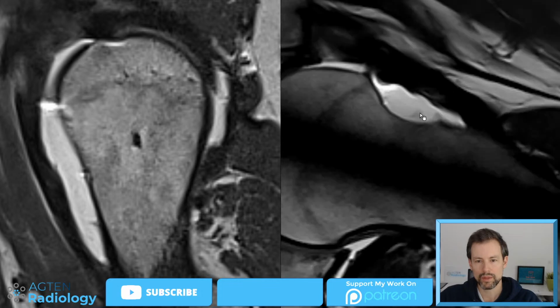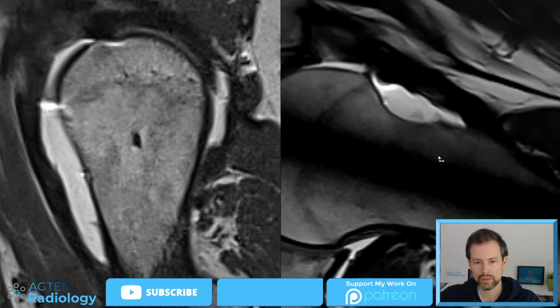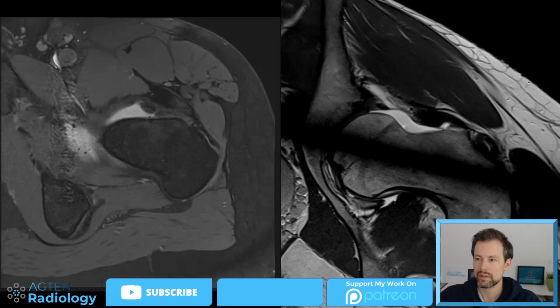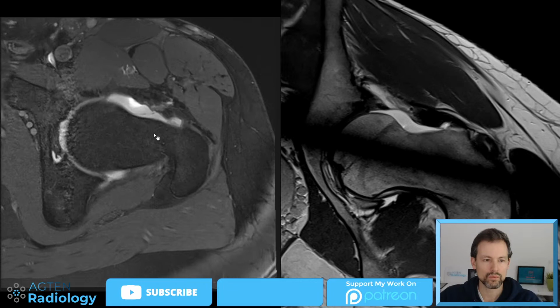This one probably also, maybe they even thought that this would be sail-like adhesions, potentially. And they seem to be connected there. So maybe I should use not a 3D, but a very thin slice. Although it's not really better visible.